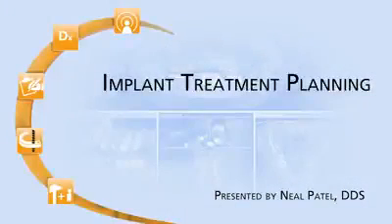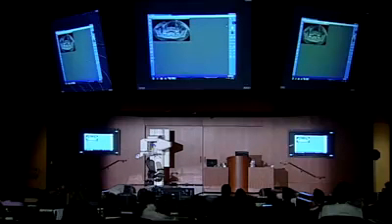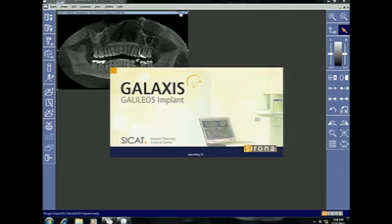All right, can everyone see the CEREC screen? Fantastic. So here's our scan that we took. Now you'll see some radiographic markers in this scan that represent that reference body, which was held in the mouth by that yellow appliance that I fabricated.